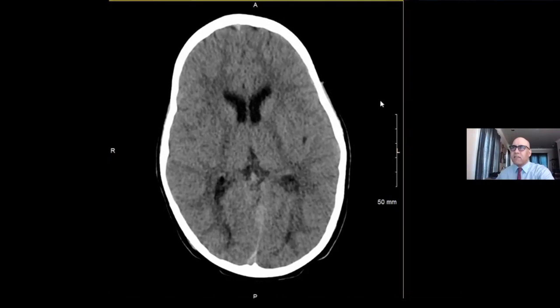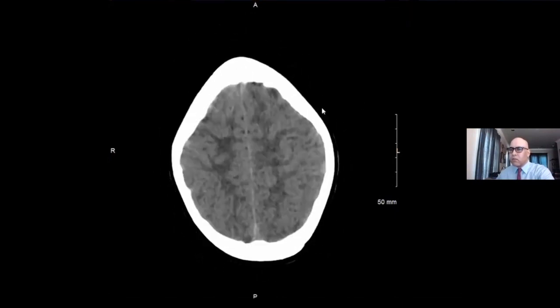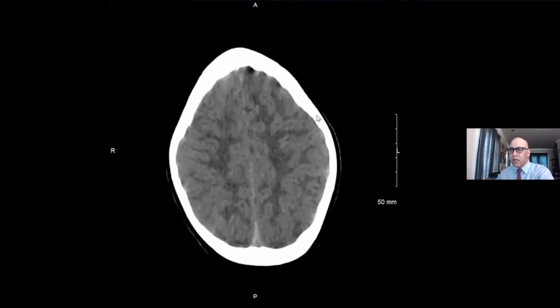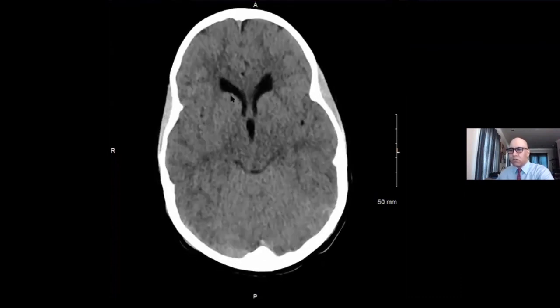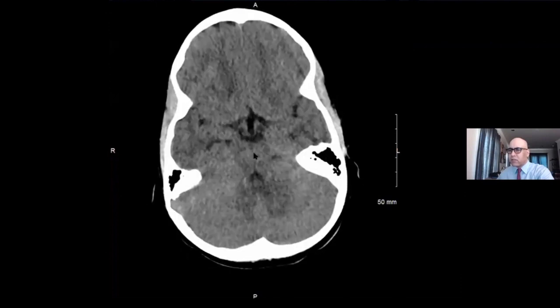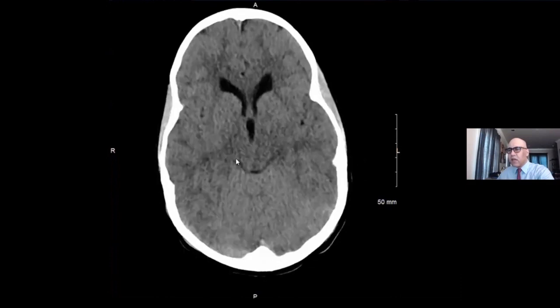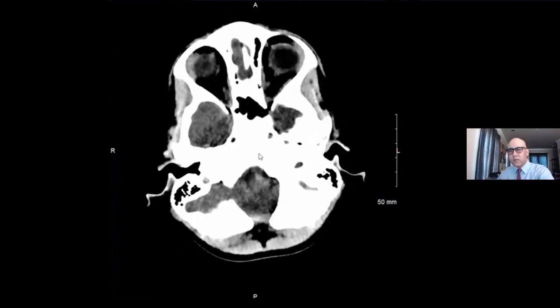This is a CT scan of the head in a 12-year-old female, and this is performed for headaches. In the process, we're seeing an upper normal caliber of the lateral and third ventricles. We're seeing the fourth ventricle normal in size. Otherwise, everything so far is looking normal.